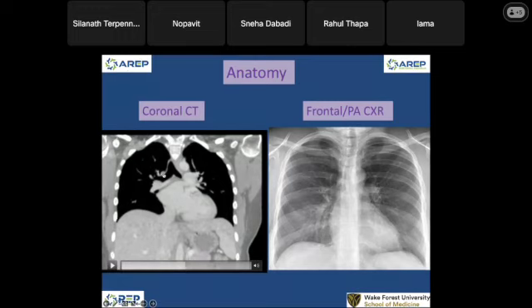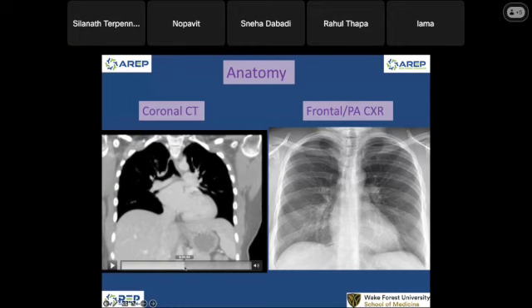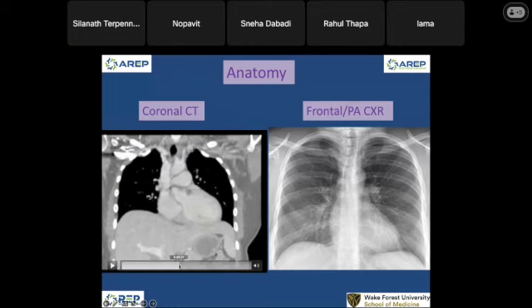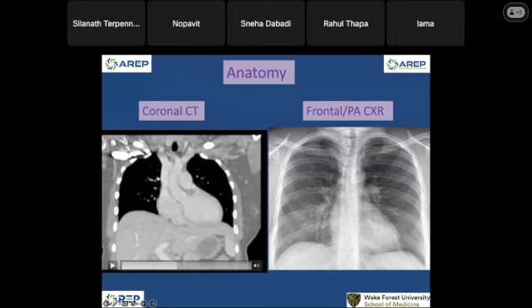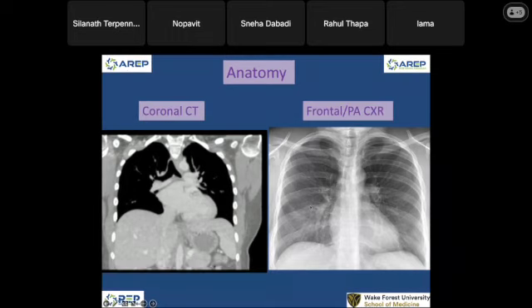That's a problem when people put the PICC in. It just plugs in there, just sits there. That structure that I'm talking about. Is it the superior vena cava, you think? My superior vena cava is here. So we are talking about this structure, which is this guy.